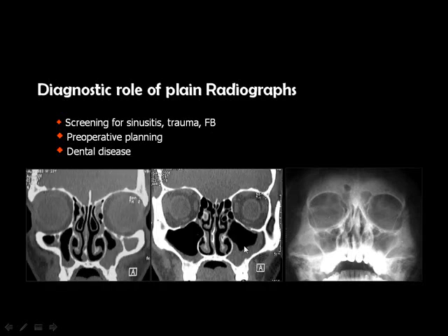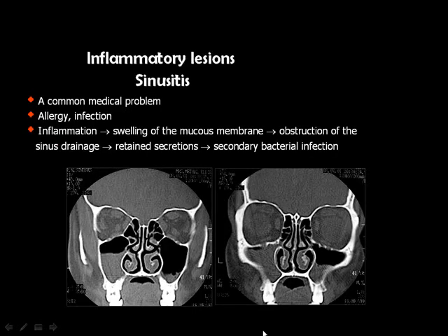But the actual judgment of the presence of paranasal sinus pathology or sinonasal pathology is the main task of the CT scan, which can be supported by MRI in specific cases. Here you can see mucosal thickening in the maxillary antrum on both sides, and in the plain X-ray, someone can say this is a clear sinus, others may say this is a veiling of the sinus, and someone may also say that this is an opaque sinus. But the main judgment is for the CT scan.